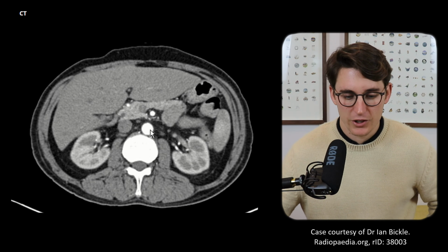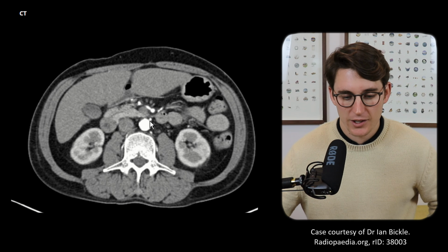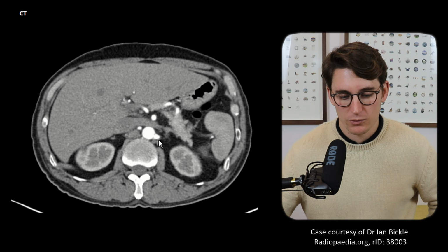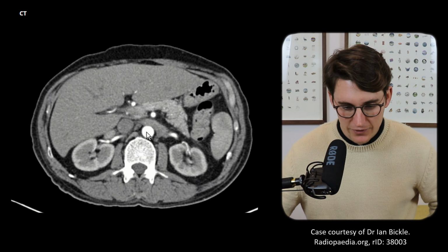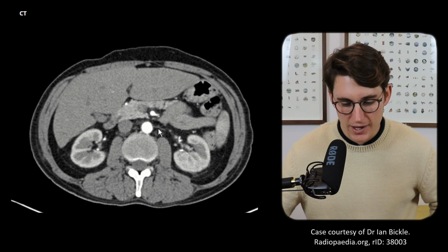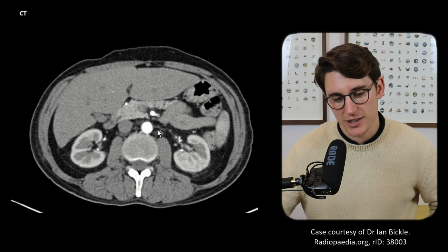We can head down further and let's get our bearings here. We can find our IMA. Now above our IMA, but below our renal arteries, if we look carefully, we might see branching off a gonadal artery. So there, perhaps on the patient's left-hand side, is a gonadal artery.